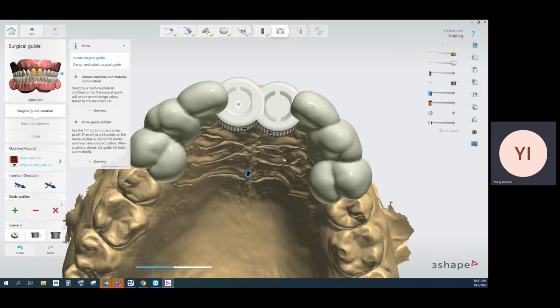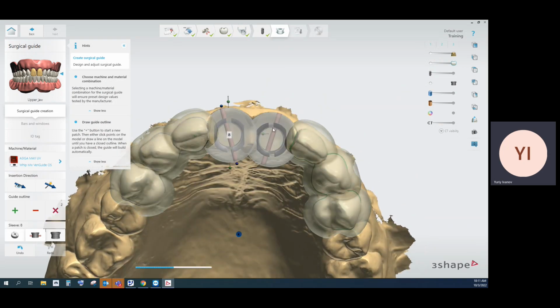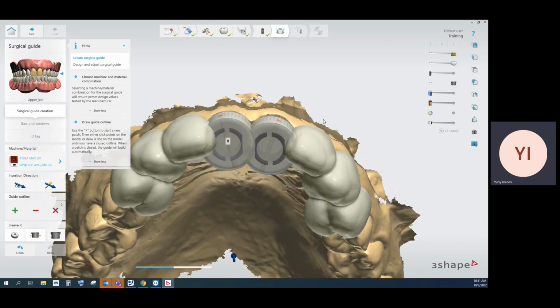So this is the way it could work, as well as the marks. They're going to be shown pretty soon, but actually the Hyoson system does have the marks even over the sleeves. So this is really useful and helpful in our case.